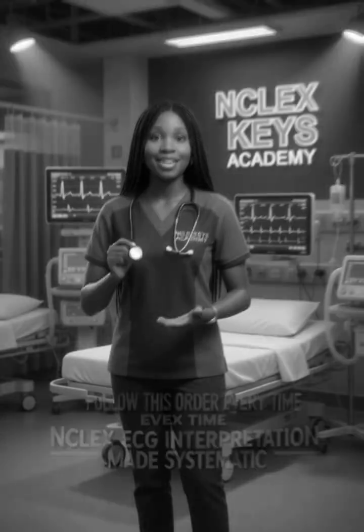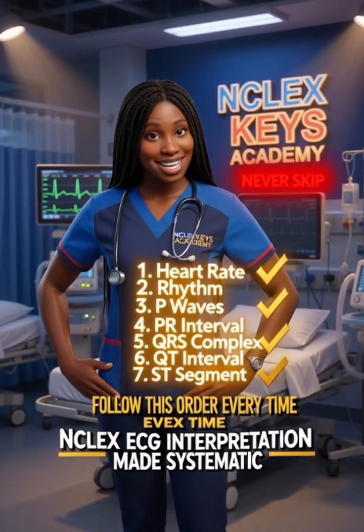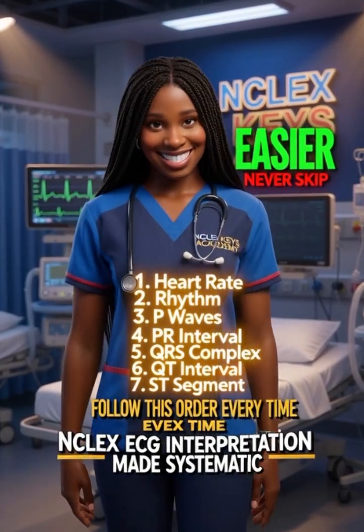Never miss this. If you follow this 7-step order every single time you read an ECG, interpretation becomes much easier and much more systematic. Never skip any step. They all matter for your NCLEX exam.